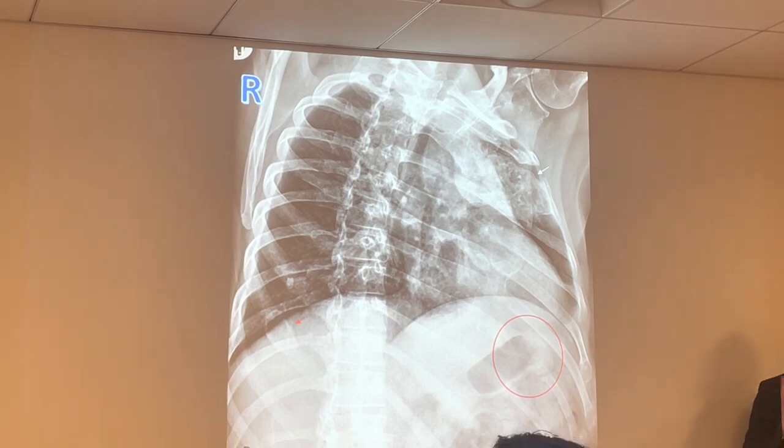All right, because I remember, I thought that was a left. Y'all, I think where y'all are making a mistake is you think that we mark the side of interest. We do not mark the side of interest on ribs. We mark the side that is touching the IR, the image receptor. Regardless, we mark the side that is touching.